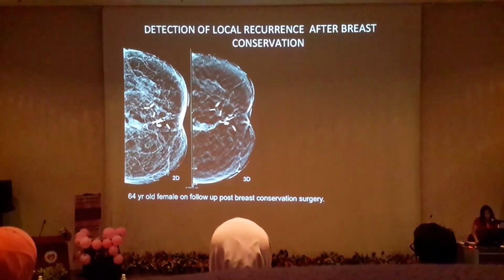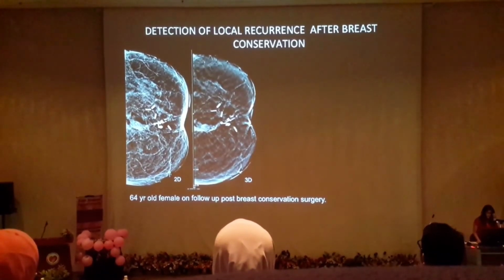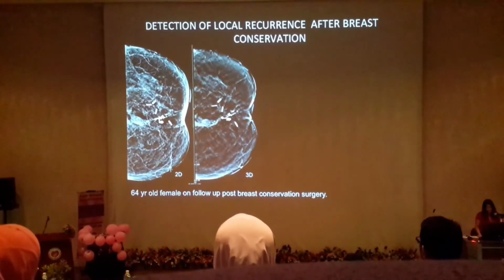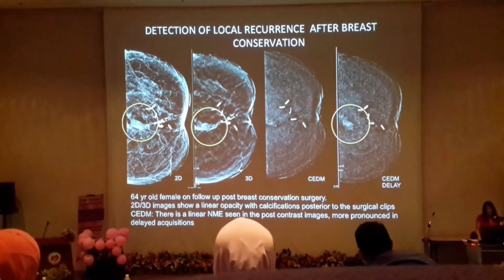Local recurrence versus scar. This was a patient on follow-up after breast conservation surgery, and she had increased linear density posterior to her surgical clips, and there were also calcifications increasing in number in that area, so we were not too sure what was happening. We did a contrasted mammogram.